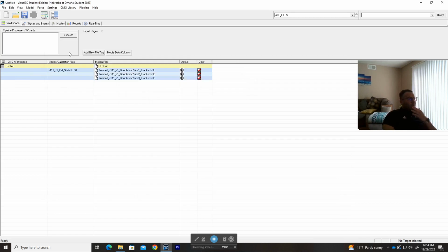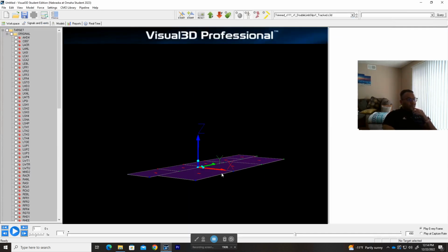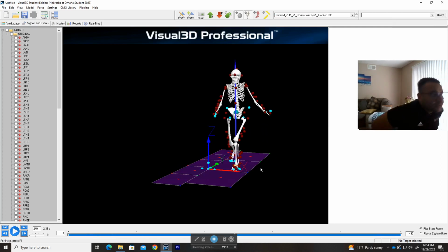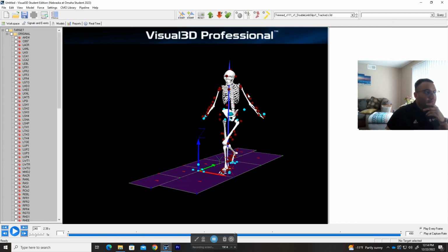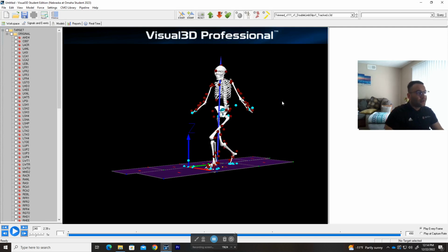Alright, so now when you close this, we go to the events, should work fine. See? Much better. Okay, but what I was trying to say here is that you see these markers are red, and that means that we didn't run any processing, we didn't filter any data or anything. So this is raw data. When it's raw, you'll see all of these markers in red.